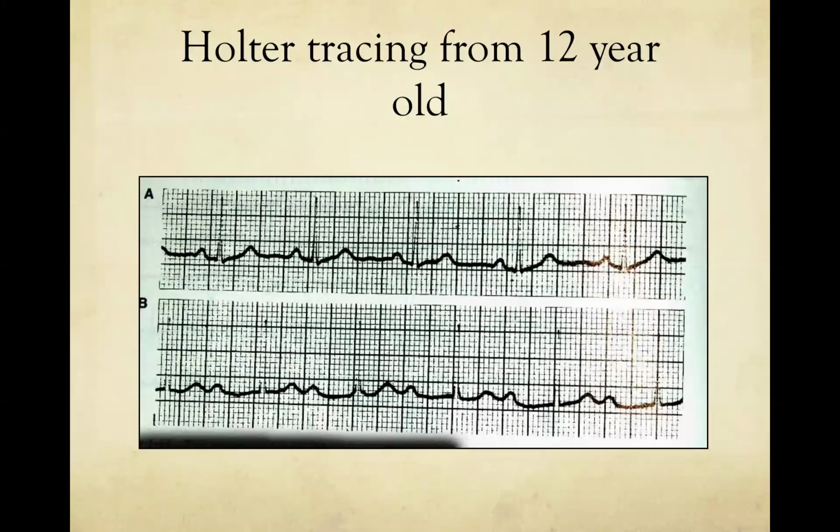Can you conduct with a PR of 400 milliseconds? Remember, this is the same patient. I think so. Going back to the strip, I don't really see a P wave which is closer to the QRS, which would mean that it's conducting there. So I'm thinking that the QRS is probably getting conducted, but it seems to be a very long PR interval.